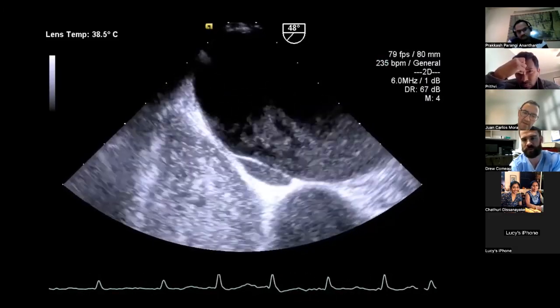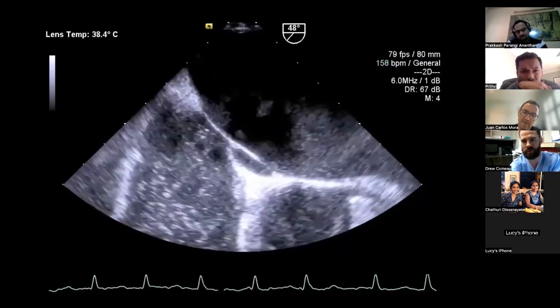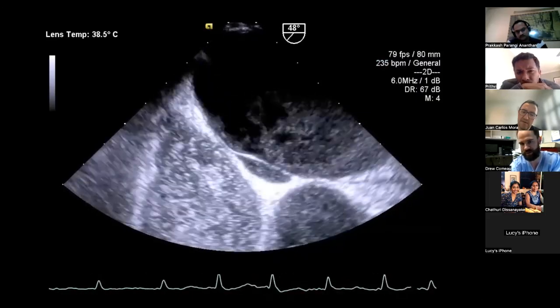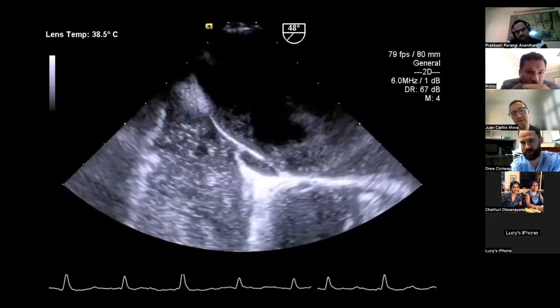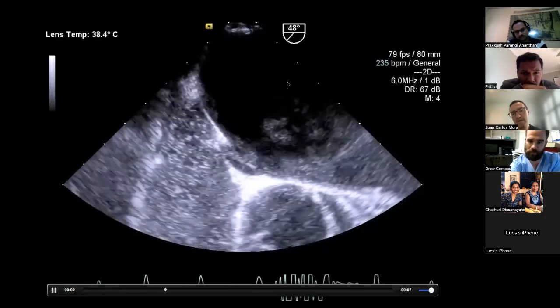It'd be useful to see the onset, to determine how many cardiac cycles before the bubbles do enter the left side of the heart. But clearly there is evidence of a connection between the right atrium and the left atrium. Fair enough, I'm probably being a bit unfair here.